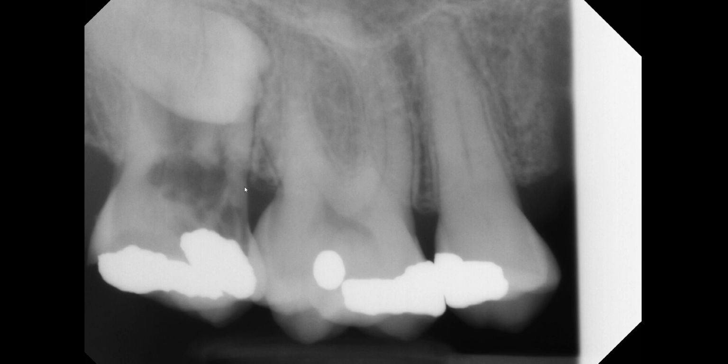And in doing so, most likely this is going to become a surgical extraction where the crown would fracture off at the level of the crest and the roots would have to be individually removed. But the complicating factor is that we have an impacted third molar right in this area. So what happens when we extract the root if we expose the crown? It may or may not heal very well, right?